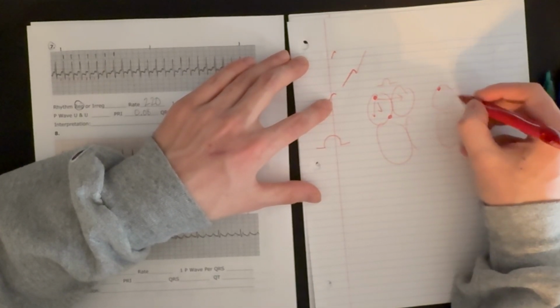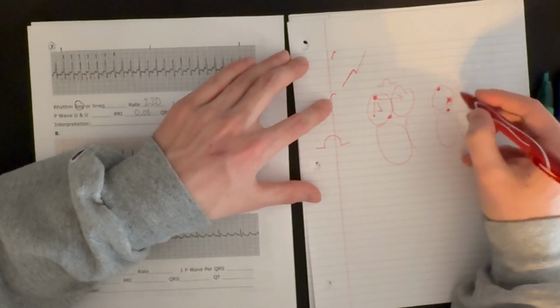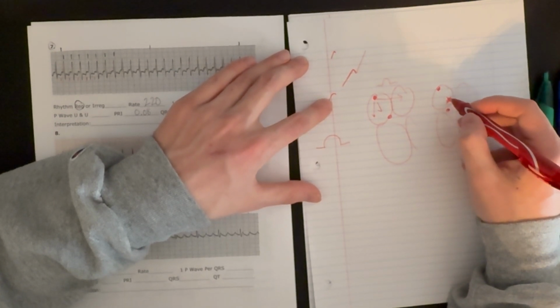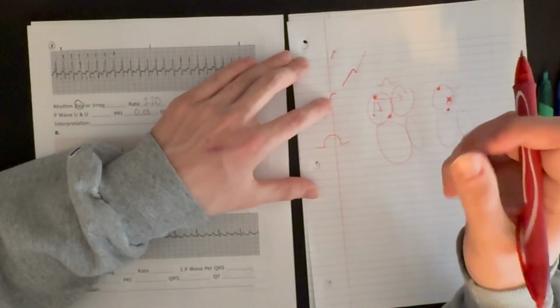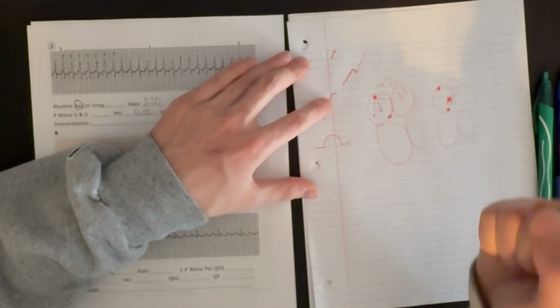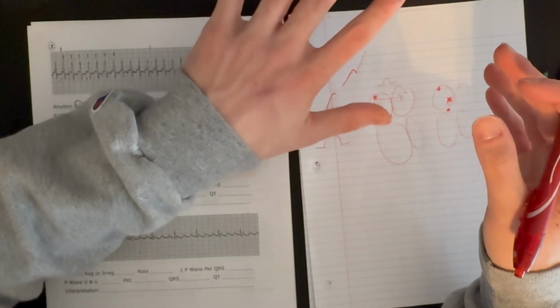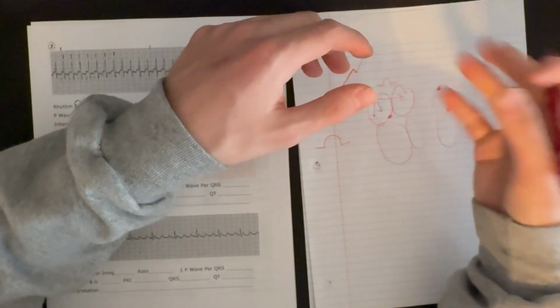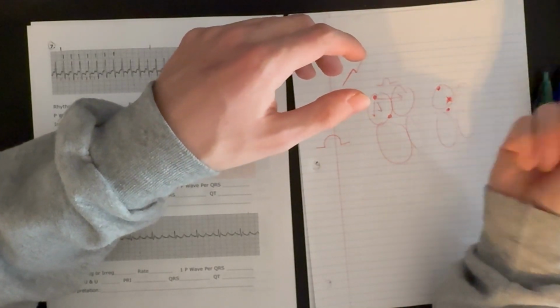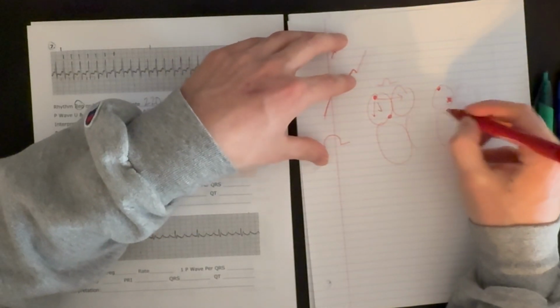is that there is some sort of tissue in the atria that's been irritated somehow. Maybe ischemia, maybe an electrolyte imbalance, and it's causing it to generate a signal on its own, an extremely fast signal. And what that does is it completely knocks the SA node out from being in control. Your SA node's firing, but it's not capturing the atria because this little tissue right here in the atria is doing all the firing.